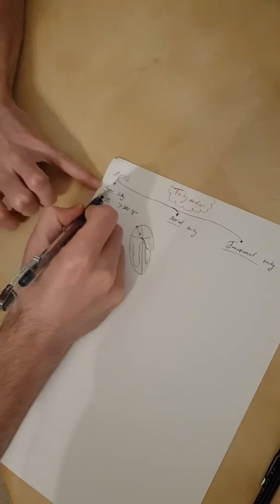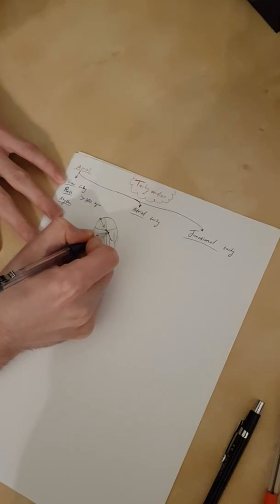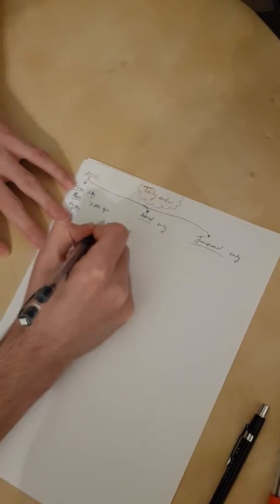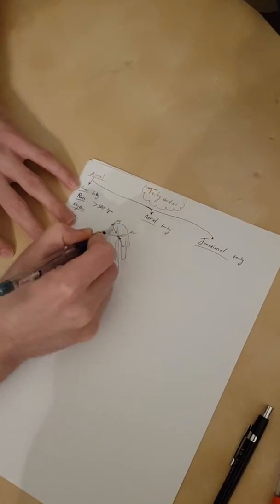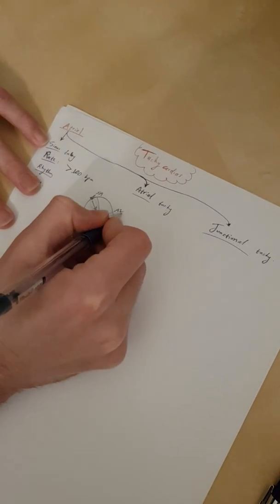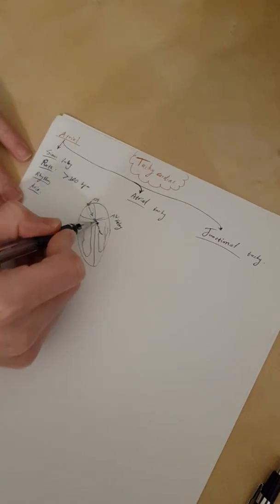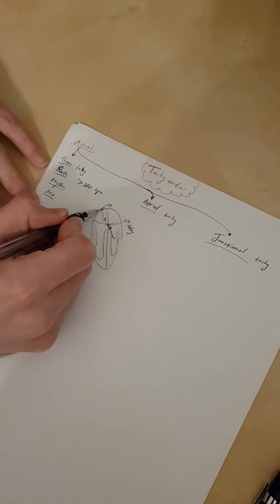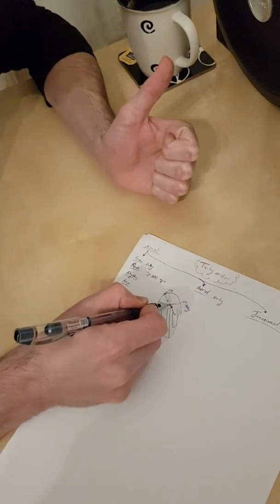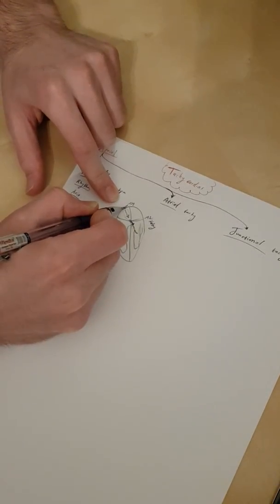So when we say it's a sinus rhythm, it means that every QRS that we get, everything before the AV node, this is the AV node and this is the SA, everything before the AV node is going to be correct. And we know that at the AV node, there's an AV delay. So everything before the AV node is going to be sinus, meaning it's going to be fine. So there is a P wave before every QRS. Every R wave we get here is coming from the SA node itself.